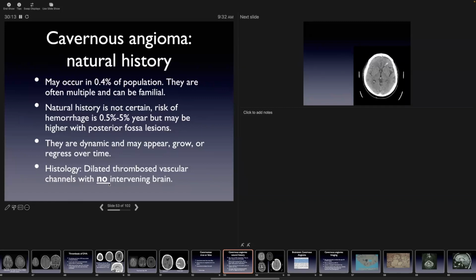And that's important because when you're imaging, if the patient is in any way a surgical candidate, what you need to establish for the surgeons is, does the cavernoma approach the pia in any part of the brain? If it approaches the pia and there is a surgical conduit to the cavernoma, then these can be resected from the inside out.